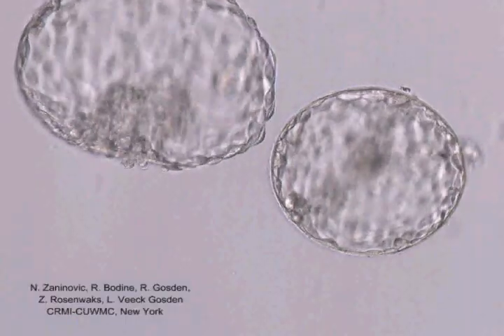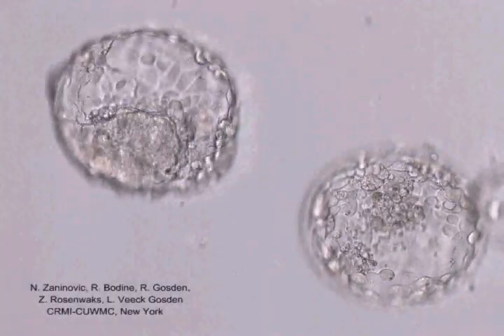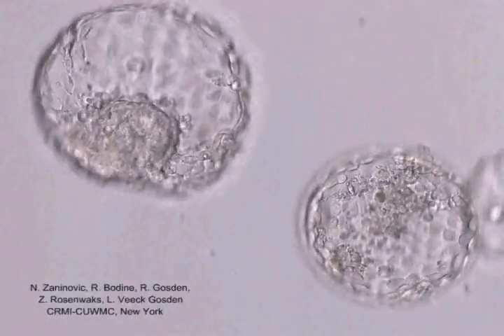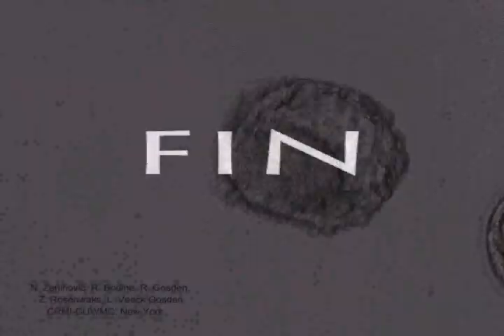Time-lapse observations in vitro can revolutionize our appreciation of the dynamics of the first 7 days of human development. They reveal the precise timing of cell divisions and morphogenetic events, such as cytoplasmic fragment formation, compaction, and blastocyst growth and hatching. Using time-lapse technology, we are afforded a great opportunity to witness the beginning of human life.